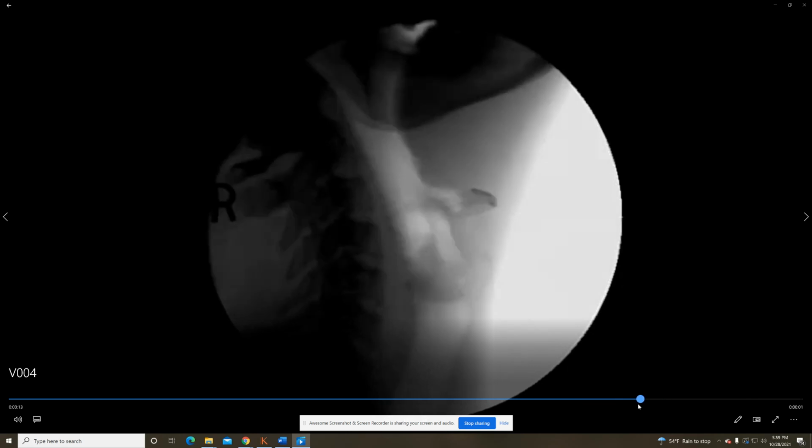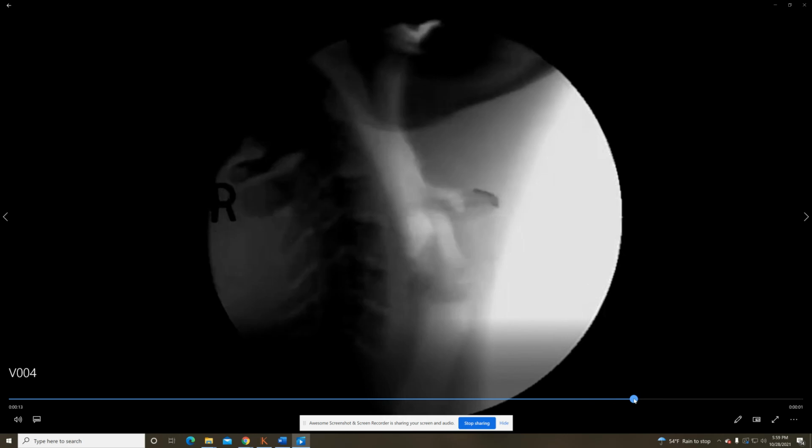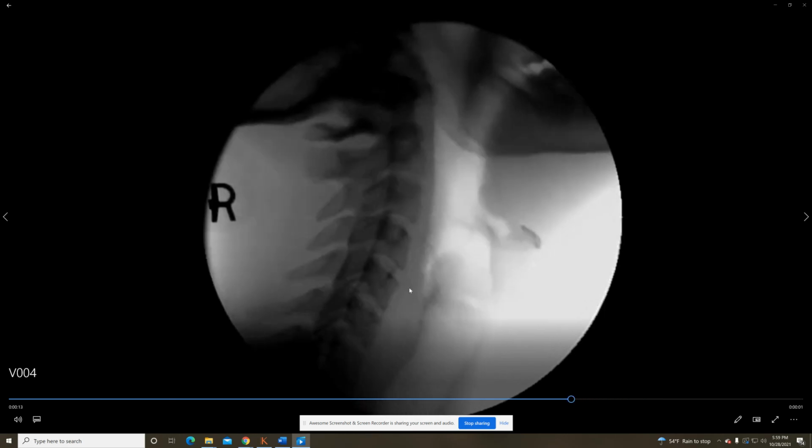It starts to get a little dark there. But we can see a shift of these vertebra. When I copied this over, it got a little too dark, but right here we can see that shifting. That's what we're looking for, because that means we've got some ligament instability.